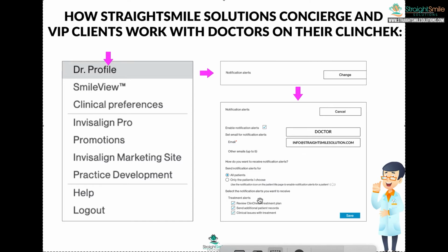If possible, you definitely want to have review Clincheck plans, send additional patient records, clinical issues. Deselect most of the other stuff because it's junk. It's just like advertisements. And that's it. Hit save. But you can't do this unless you're one of our VIP or concierge clients. Not premium, not a la carte. If you get it, we'll be like, bye. So it's only for VIP and concierge clients to be able to do this.